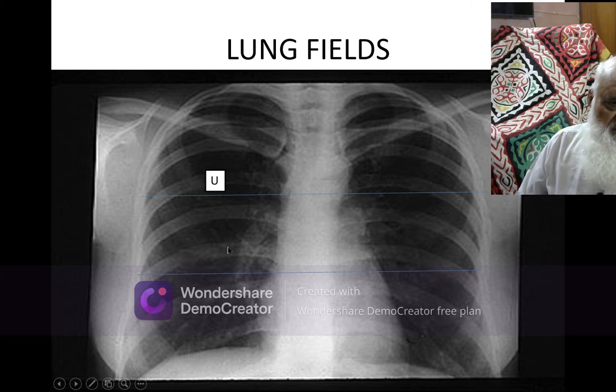The third thing, which is an alien one, an opacity for example, is abnormal, always abnormal, until and unless proved otherwise. It should be remembered and keenly observed. The X-ray should be seen very, very clearly. The apices should be compared, then the upper lung should be compared, second intercostal space with the second intercostal space, third intercostal space with the third intercostal space. In this fashion you go down until the costophrenic angle. If there is a mismatch between these 2 fields, this means something is going wrong.